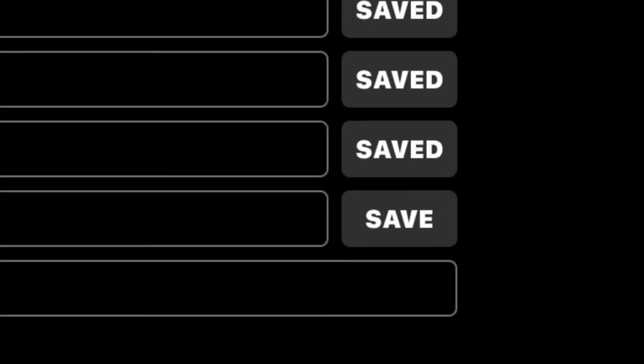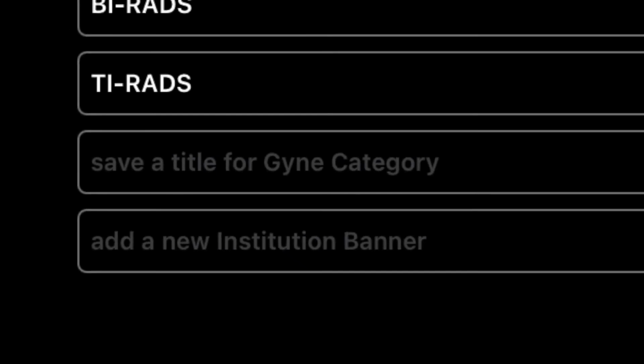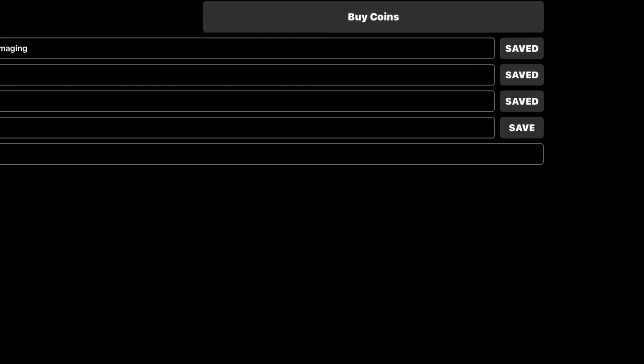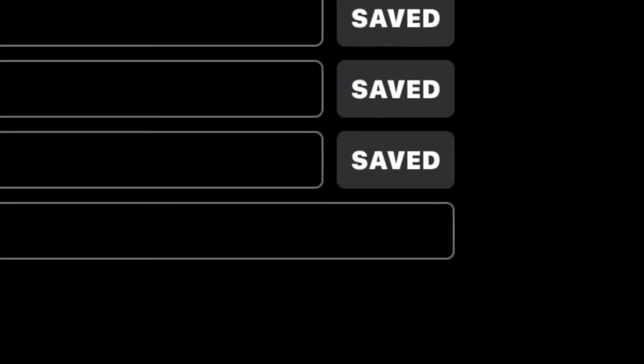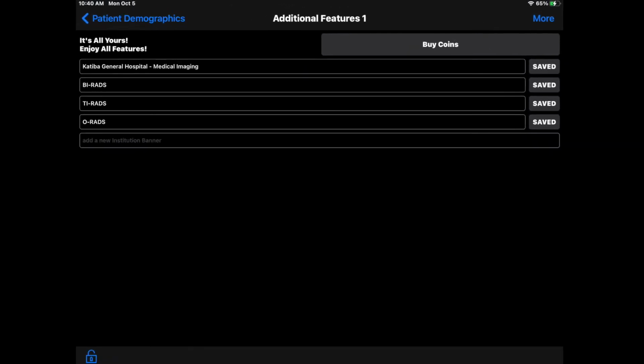Tap Save. Select the field related to gynecological category. Enter your desired title for gynecological ultrasound category. Tap Save. You have successfully saved the name of your institution and ultrasound categories.